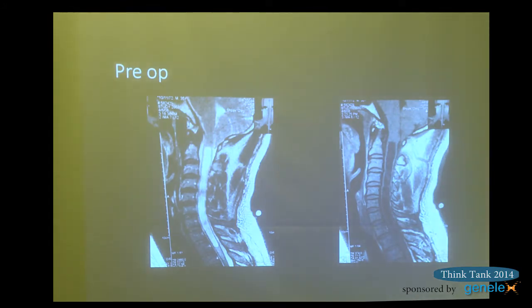Here's another fellow with the same problem. He comes 6 years ago with tonsillar ectopia. This is way low. This is a Chiari malformation. This is his spinal cord with a large syrinx. The fluid within the cord is a syrinx.